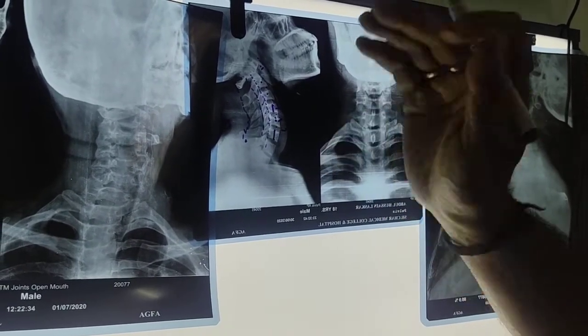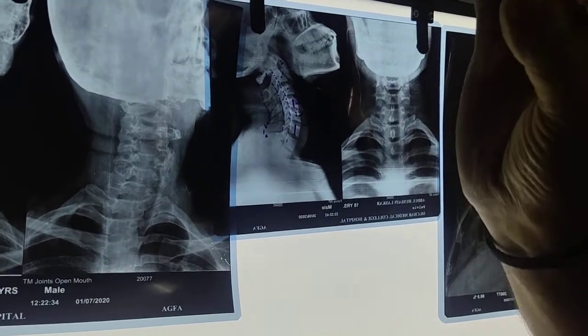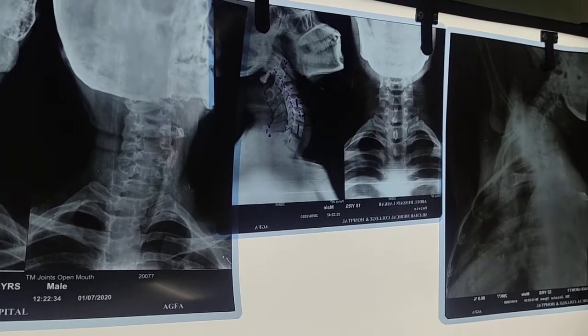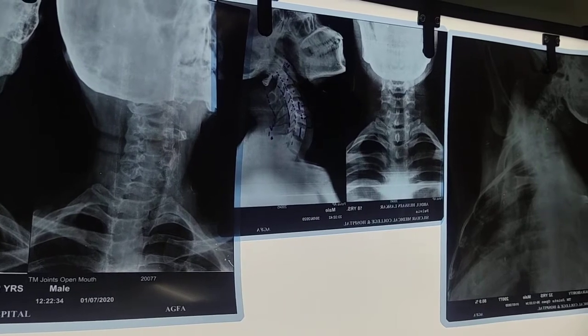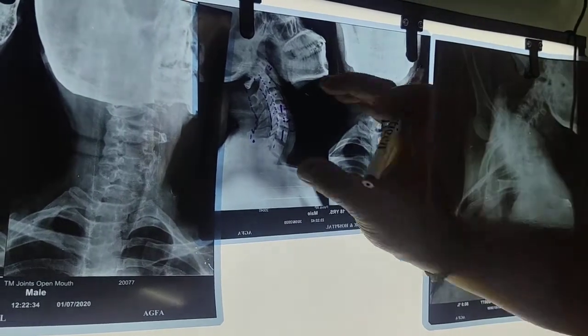If it is coming down, only 3 is coming, then almost 75% is still there, but 25% is reduced. This is a sign of instability here. Unlike in the other vertebra in the lumbar-sacral spine where you consider it up to 50%, in the cervical spine it is only 25%. On the other hand, local Cobb's angle, it's a regional Cobb's angle.